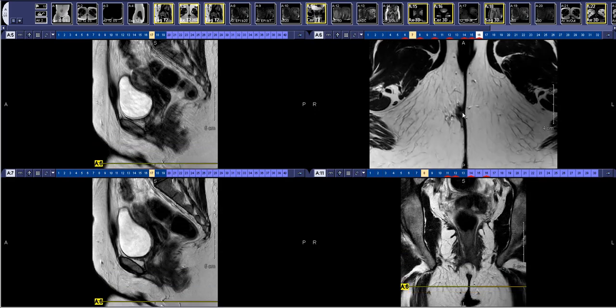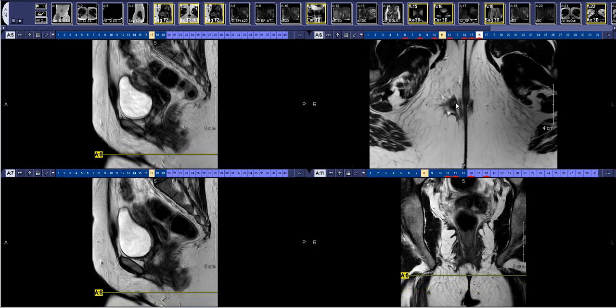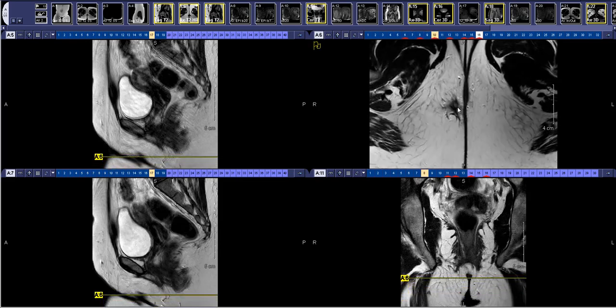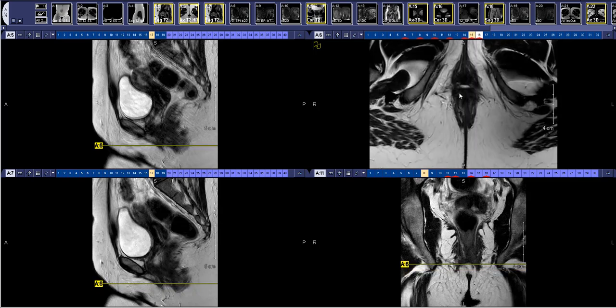So here is this person's anal fistula. It's here in the medial gluteal fat. So coming from inferior to superior, it passes in the medial gluteal fat, goes through the external anal sphincter right around here, and we generally describe the sphincter as a clock.